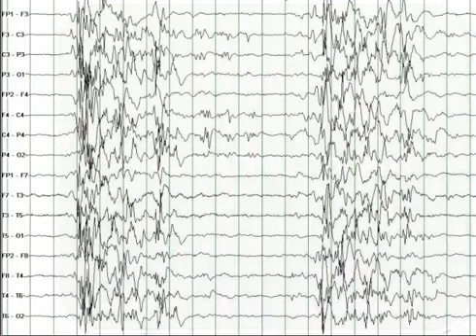Today I will cover burst suppression pattern on the EEG and generalized periodic epileptiform discharges. Let's start with a quick orientation.